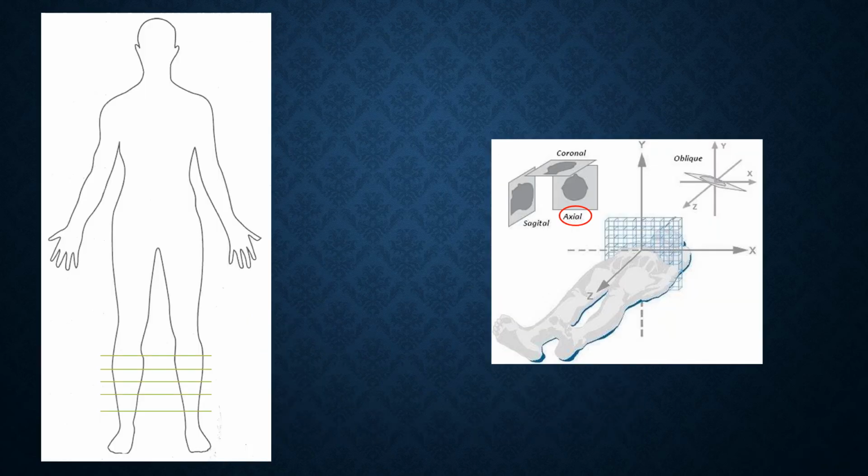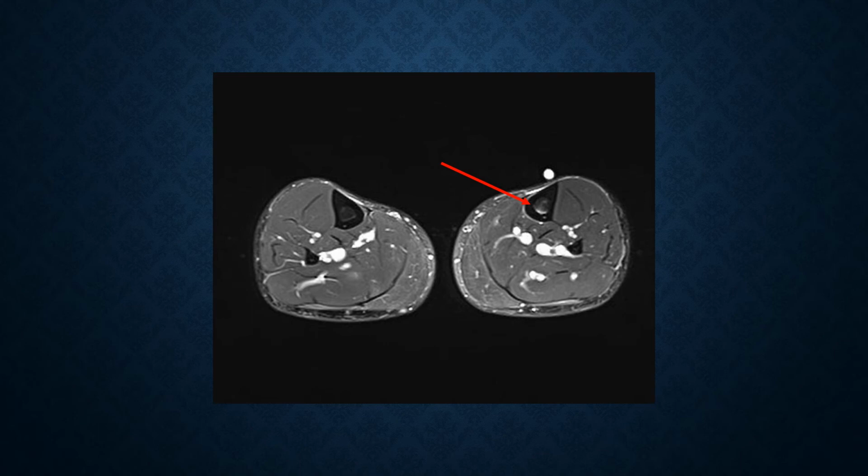Admittedly, axial views of the tibia, fibula, and ankle are initially harder to assess until you get a feel for them. Remember that the axial view images are sliced perpendicular to the tibia, which allows us to get a cross-sectional view of this area. So here we have an axial view T2 tib-fib MRI. Again, things that are water-based, like edema, will show up bright on a T2 weighted MRI. So on the patient's left tibia, we can start to see some bony edema that is starting to permeate through the periosteum into the marrow. This would likely be labeled as a grade 2 based on the Frederickson classification system that we discussed earlier.